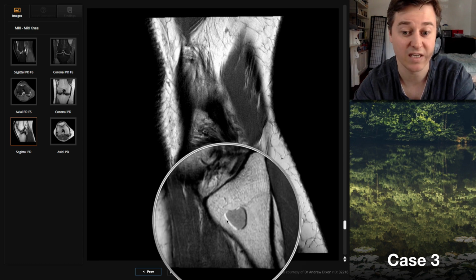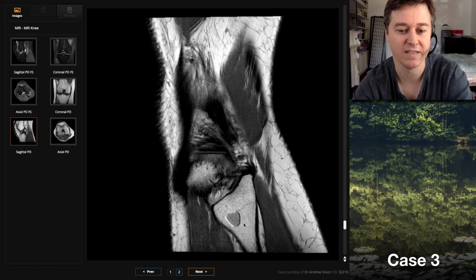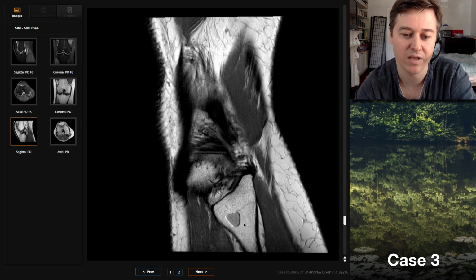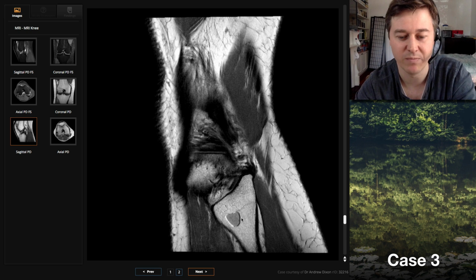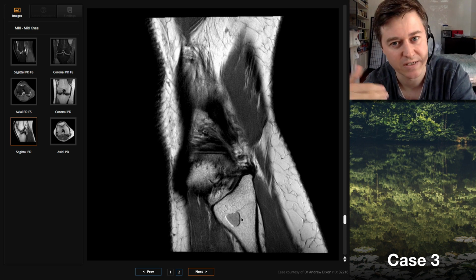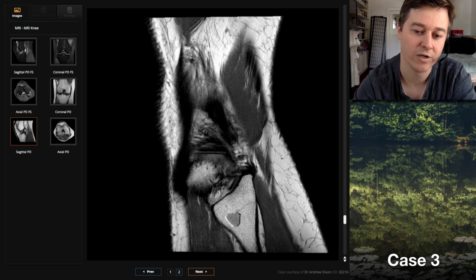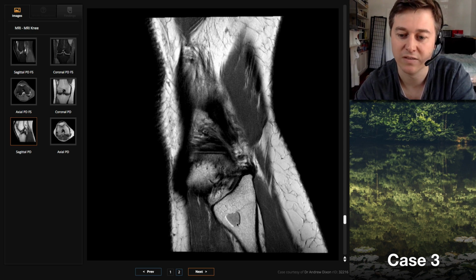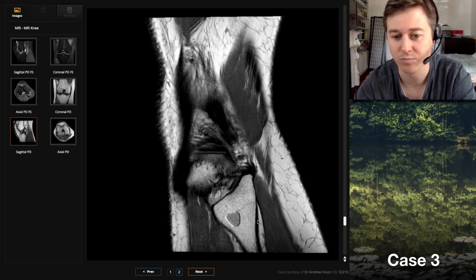that chemical shift. So if you see that chemical shift with a T2 or PD hyperintense lesion, then think about a chondroid lesion. And obviously they're very, very common. And you know about how to report those, and probably best to say a low-grade chondroid lesion such as an enchondroma, just because we know that sometimes low-grade chondrosarcomas can look like this. I try not to mention low-grade chondrosarcoma in the report though, because it scares people too much.